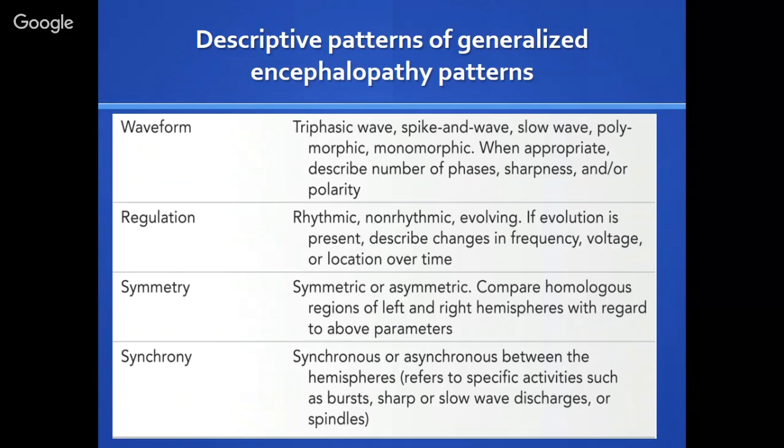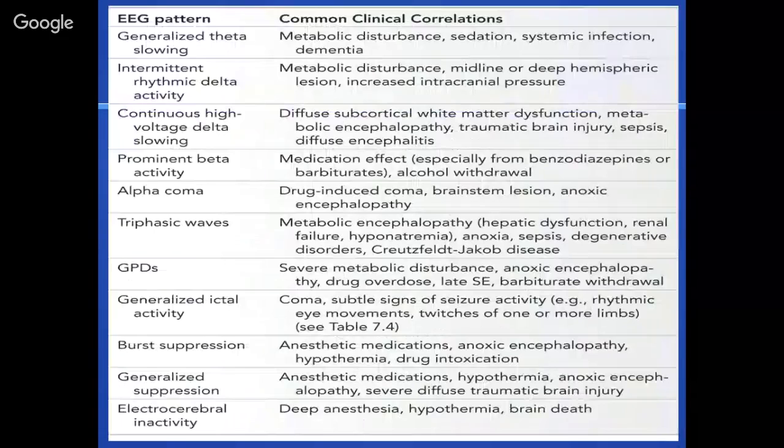They appear sometimes very aggressive, but they could be synchronized or asynchronous like BIPLEDs. BIPLEDs means bilateral independent periodic lateralized epileptiform discharges. The I is for independent. All right, so independence. Okay.